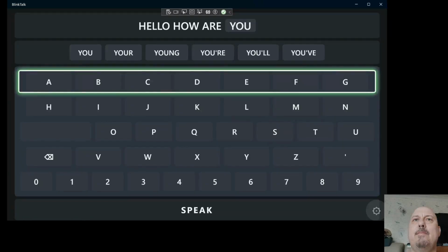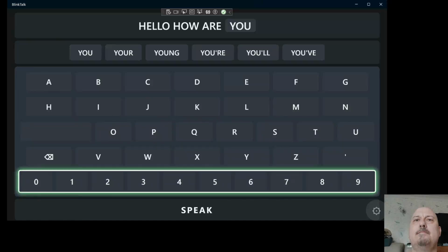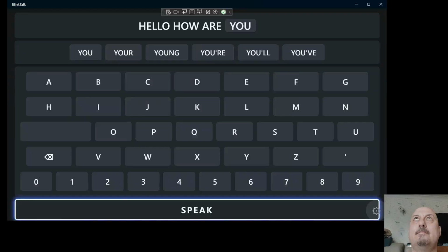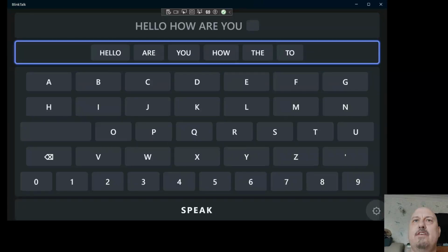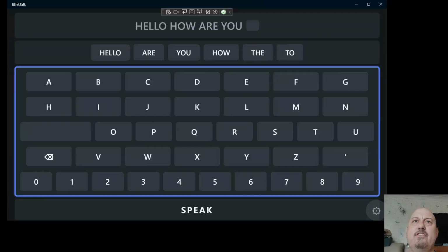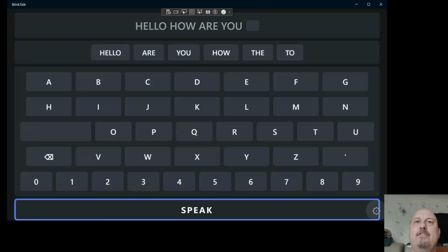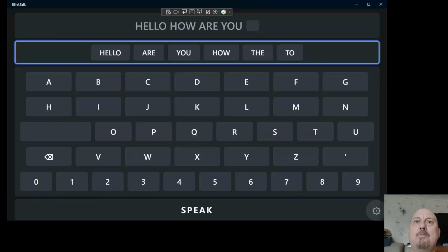And then I'll wait for it to come out of the keyboard so I can tell it to speak. Hello, how are you? So, as I said, it starts to learn what you're going to say next. So, if someone else now visits, it knows that "hello, how are you" is something that I will normally say.